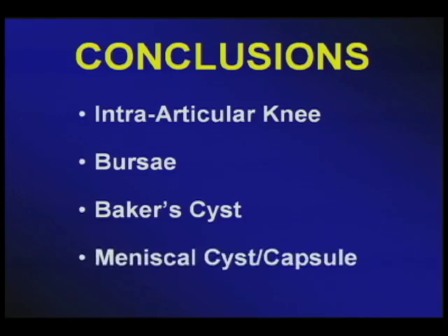Last but not least, although we will still continue to use MRI for meniscal lesions, it is so much easier to detect meniscal cyst and meniscocapsular separation.